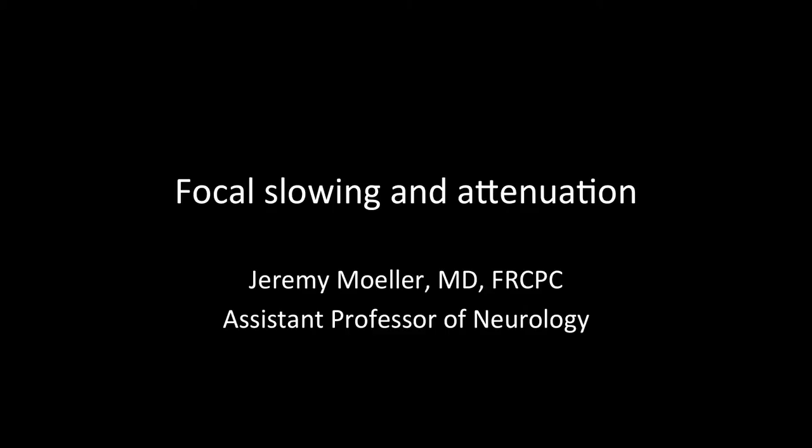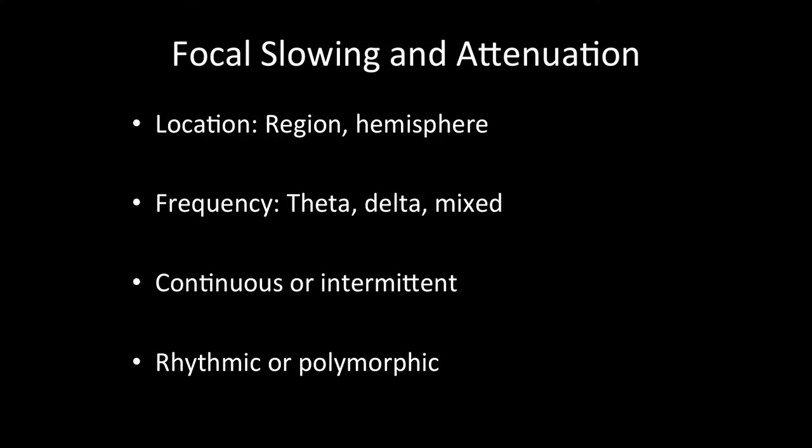In this video, we will look at focal slowing and attenuation. There are several important considerations when looking at focal slowing and attenuation. It is important to recognize and document the location. Does it involve a region or the entire hemisphere?